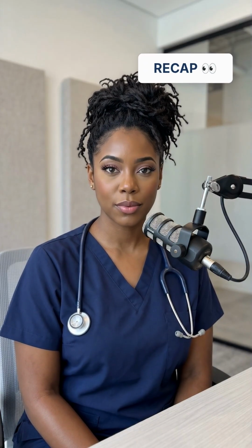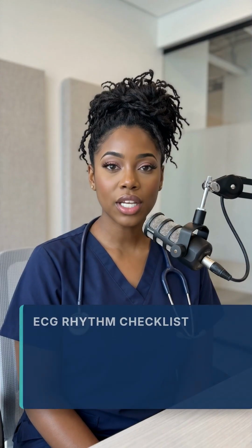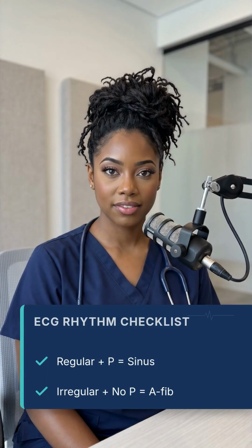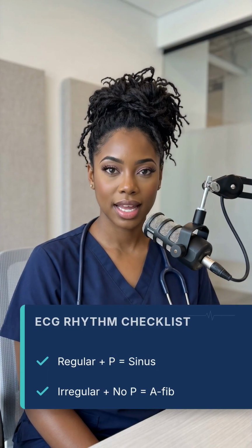All right, let's bring this all together. Step 1, check the rate. Step 2, check the rhythm. Step 3, look for P waves. If it's regular with P waves, it's sinus. If it's irregular with no P waves, think AFib. Keep it simple, and you'll get it right every time.